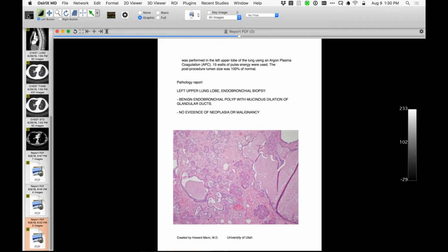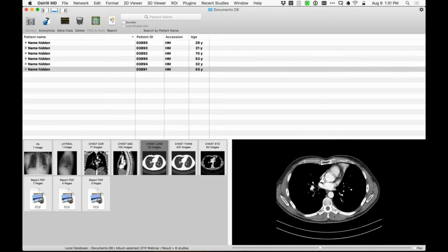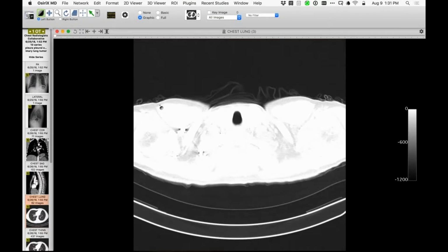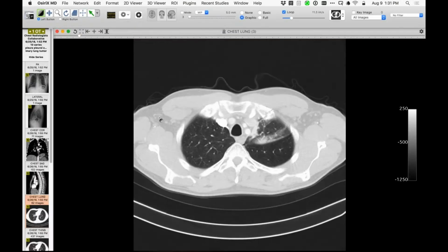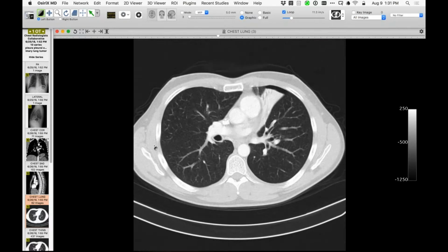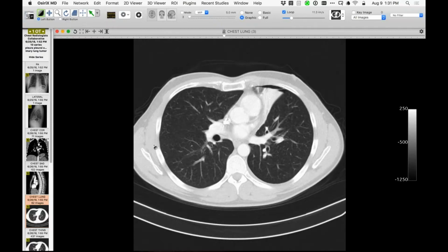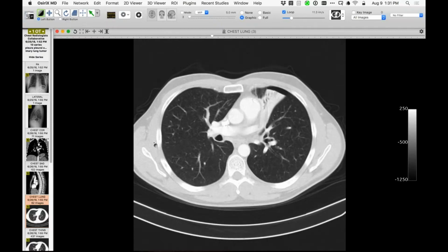David, you like that one? I love it. It's beautiful. So this is the most convincing ex vacuo that I've ever seen. It gets promoted a lot, but it's not very convincing. This one is convincing, with that upper lobe distribution right outside the collapsed lobe, just hugging that one area. Yeah, it's curious, isn't it?